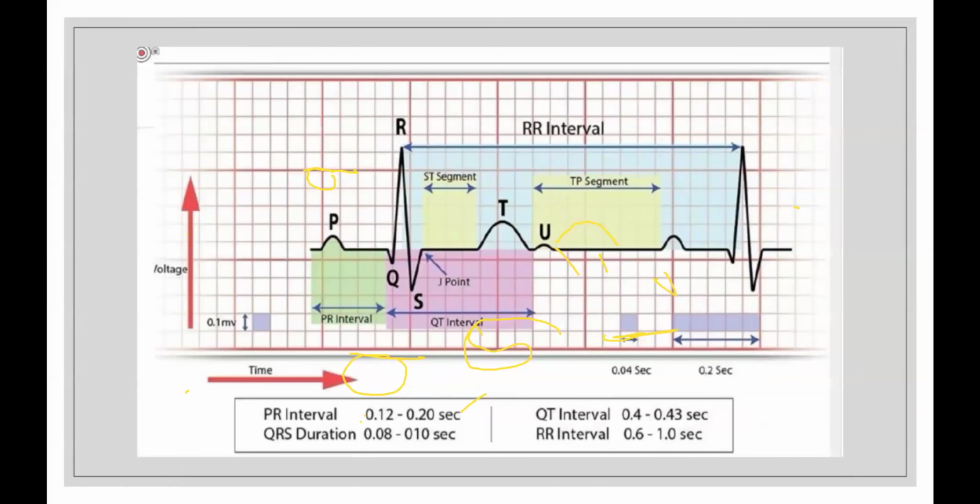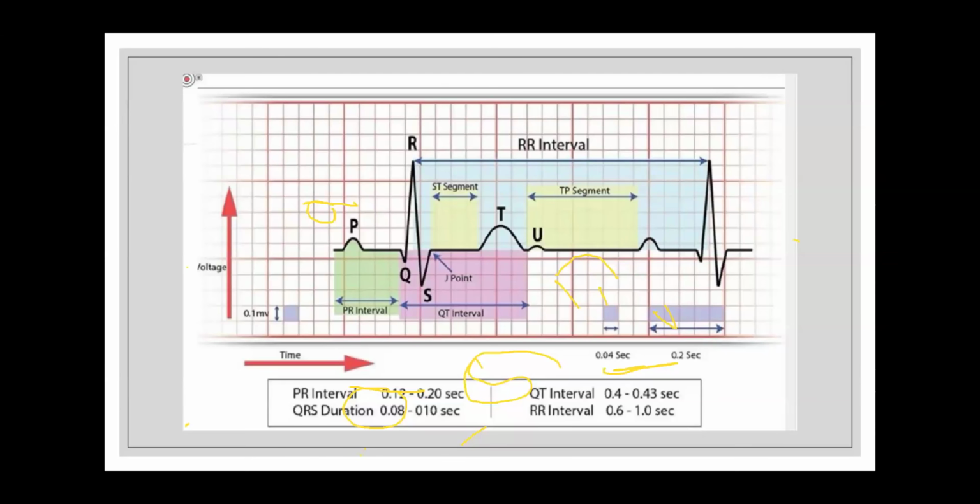Now look at this. Okay, now it seems complicated again, but see what we are seeing in the ECG. First of all, we have waves. Okay, so we see waves. We have three waves which we see on the ECG. The first wave is the P wave. The second is the QRS complex. Third is the T wave. This is normal in every ECG of a normal person or a normal child, as we are talking about pediatric ECGs. So in normal children, the ECG should contain these three waves.